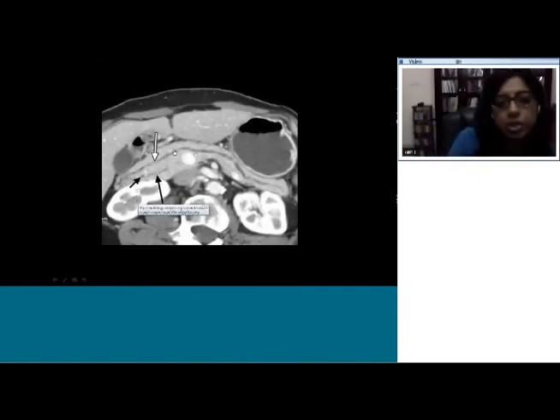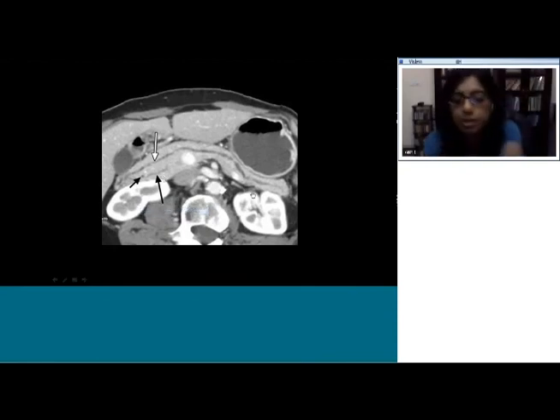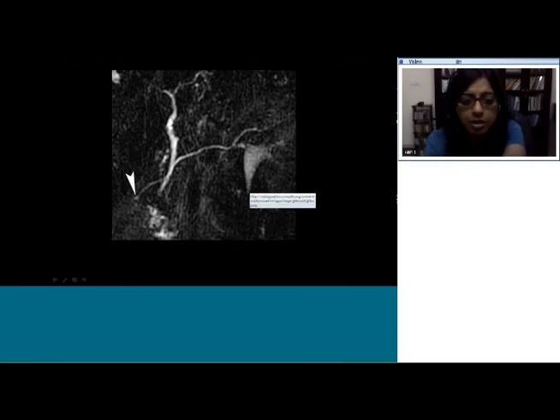The duct that goes posteriorly is the duct of Wirsung. So they're separate cases, but they both show the same thing, which is pancreatic divisum. So it's not necessary to be able to identify separately the Wirsung, to see that it doesn't join. The fact that the duct crosses or cuts across the distal CBD itself is the clue for these cases. That's it.